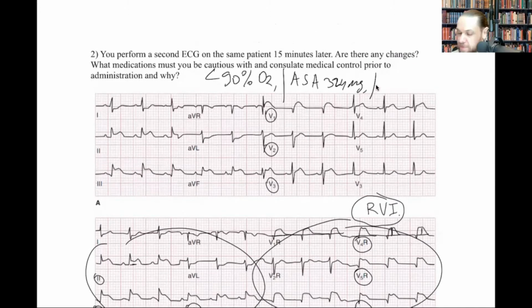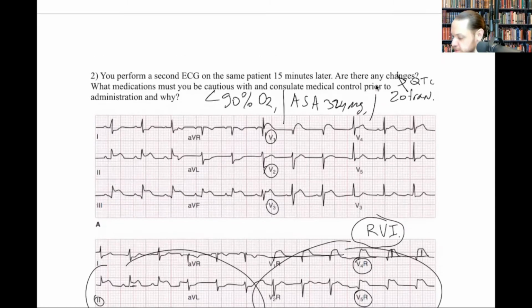Yeah. If they have active vomiting, and they don't have a prolonged QT interval, which this EKG doesn't show, they could also get Zofran, or it's called ondansetron. You want to make sure there's no prolonged QTc interval, right? There's no prolonged QTc interval. You're going to give it in increments so they don't vomit, 0.1 milligrams per kilogram. You don't want to exceed 8 milligrams in total with your administrations.